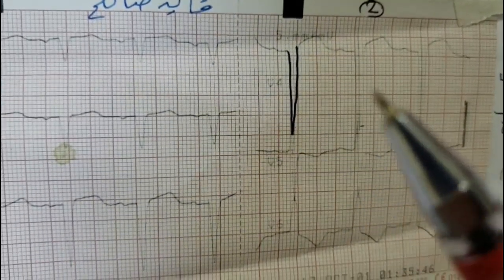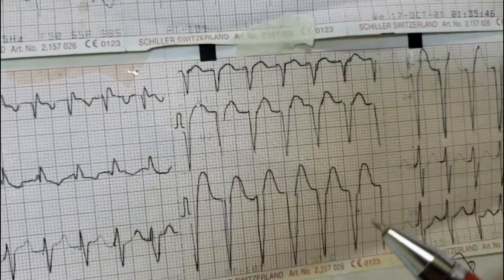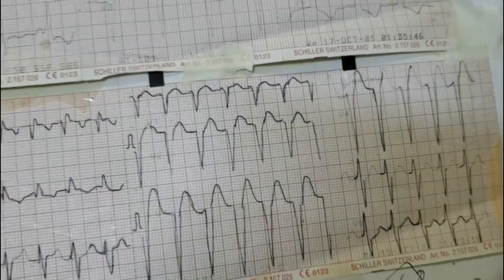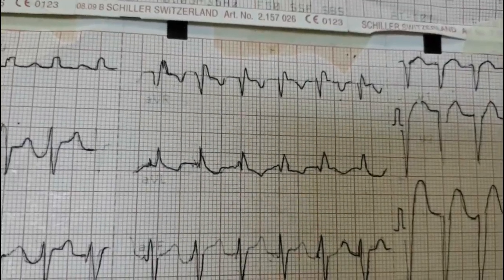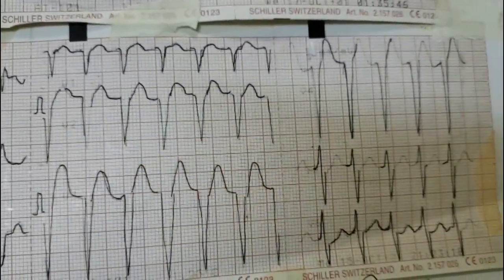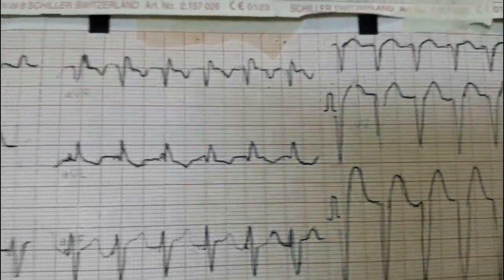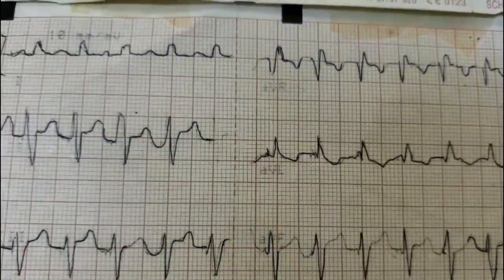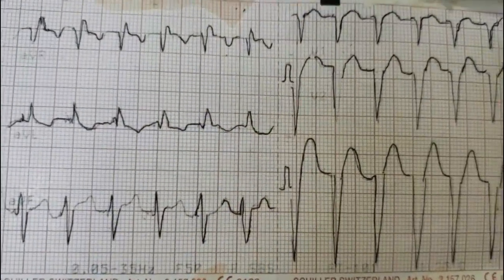the lateral side. Here the same patient came with tachycardia. This is wide complex tachycardia, but it is not hugely wide complex, it is relative widening, but there is a change of QRS complex morphology also with tachycardia. Here the differential diagnosis: it is a supraventricular tachycardia with fixed bundle branch, left bundle branch block. That is aberrant conduction.